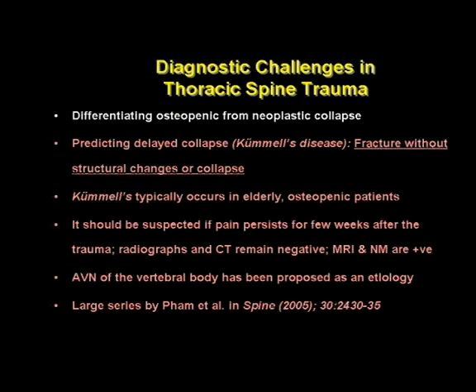So basically, you should know that with an elderly person coming with pain after an injury, with a normal thoracic or lumbar spine, keep in mind, if pain could persist, that this condition could be there and the patient could come with collapse. And I'll show you 2 examples of those. Both of them are burnt on my anterior cortex because they were terribly embarrassing.